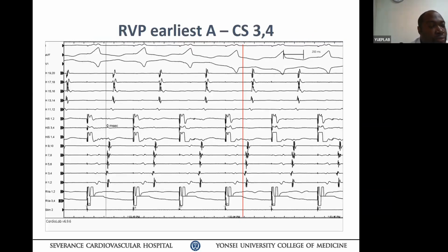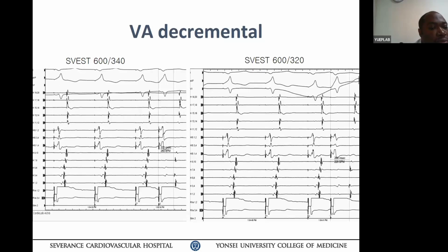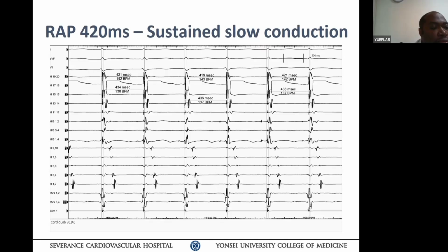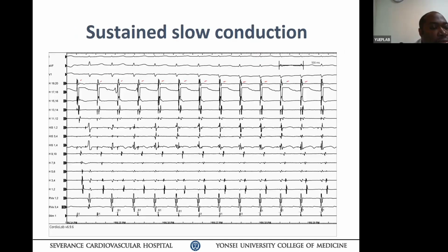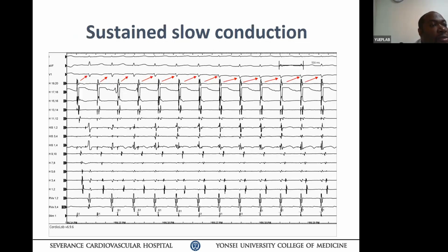So basically, you're showing that the patient has dual VA conduction, septal and the CS, right? That's what you're showing. So the patient had basically fast-slow fusion here. Okay, let's go. And then it's also typical. Keep going. Three more. So basically, what you show over there is a crossover phenomenon we see quite a bit in pediatric age. That's nothing uncommon. Patient has slow pathway. Okay, keep going.